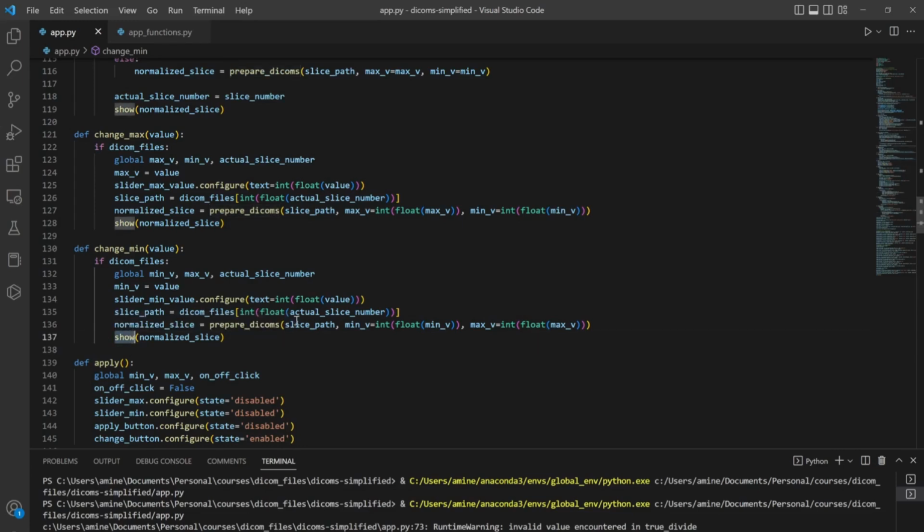If you need to change anything in this function, you can just customize it here. Otherwise, you can use it directly as it is.